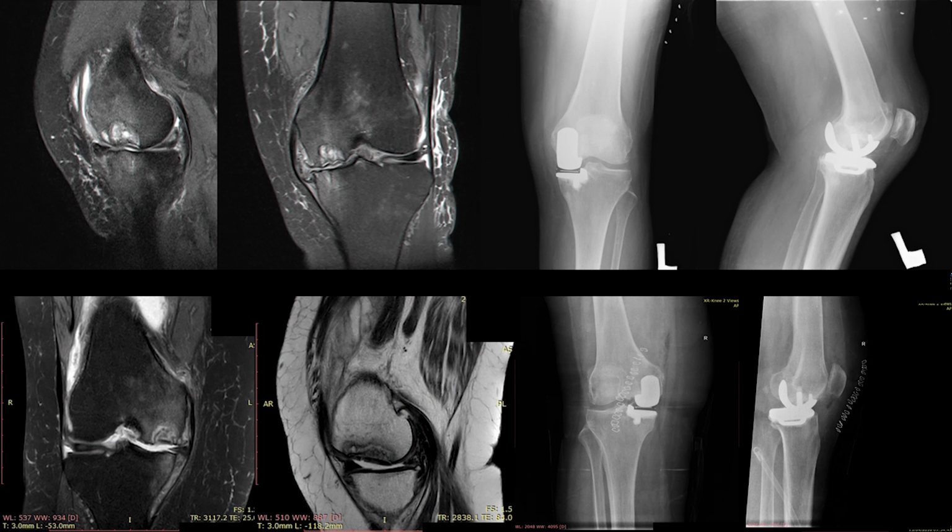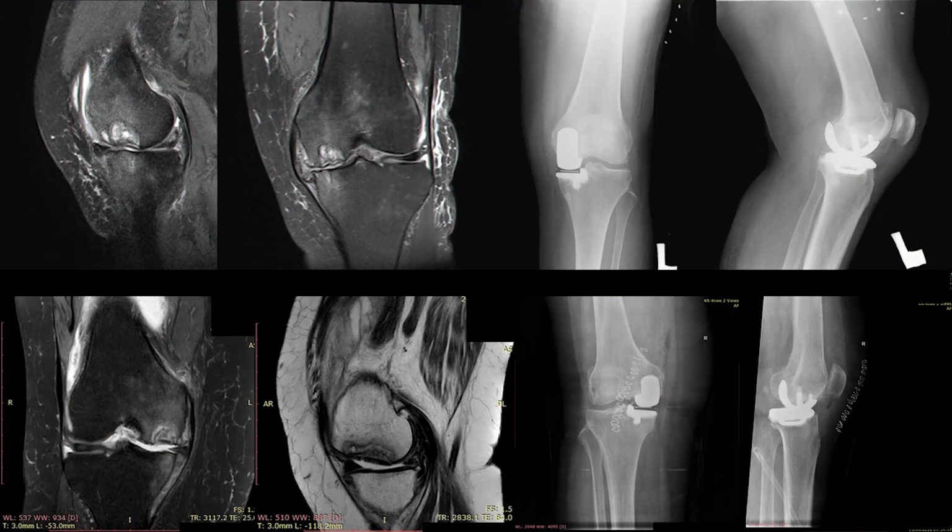And in Israel, we have a lot of patients with AVN of the medial femoral condyle. This is something which is probably hereditary to some extent, because while working in England, I came across very few cases of avascular necrosis needing partial knee replacement. And you can see a few cases here. Is this suitable for UNI, yes or no? Yes, it is possible. Even this defect can be covered by UNI, especially if it's very anterior. So you can really pre-plan your surgery very well.